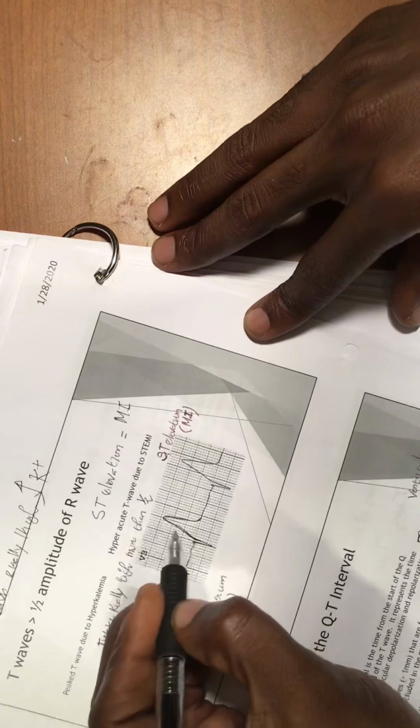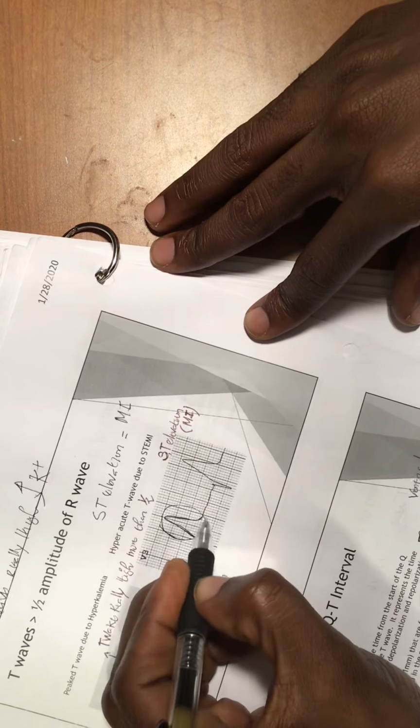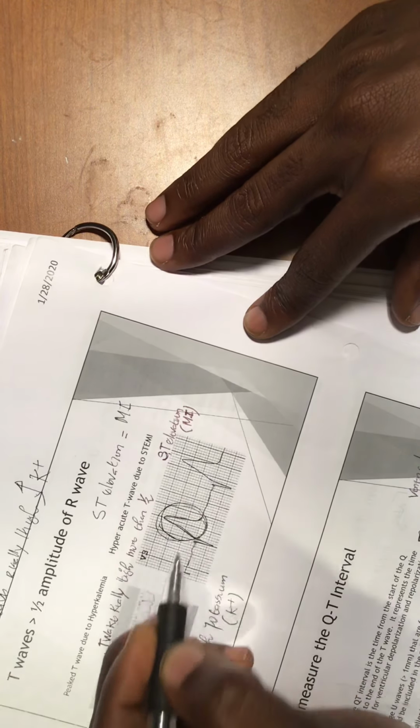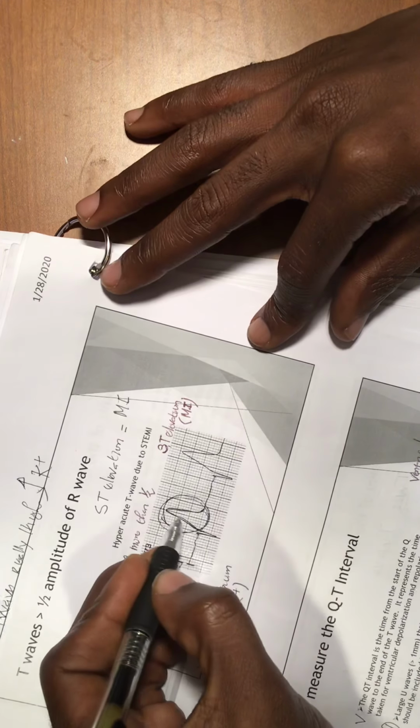This is mainly what you would see in ST elevation in MI, like someone who would come in the clinic with chest pain, with irradiation in the jaw, or in the back, or in the shoulder, or in the right arm or the left arm. So this is the main thing you're going to be seeing: an elevation of the ST. Or sometimes you might not have something to see with MI.